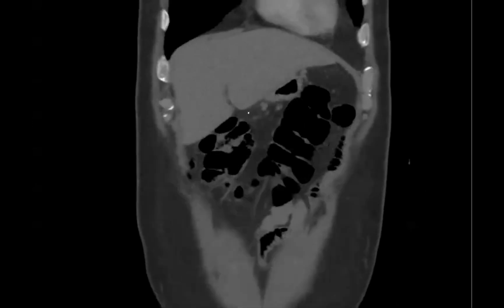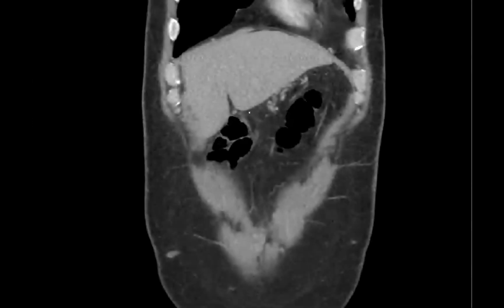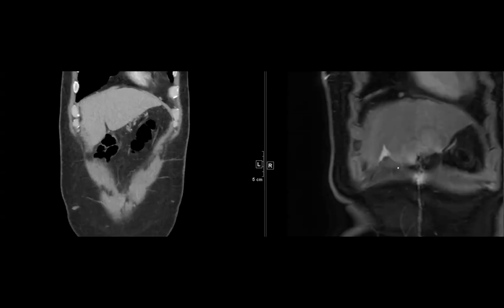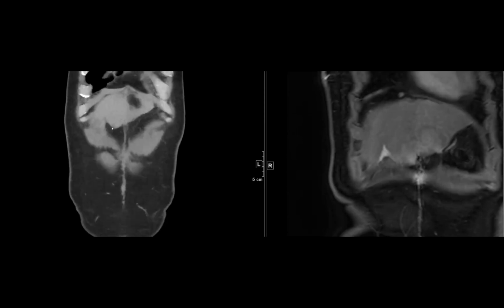Right, look, this was pretty clean looking, and I would expect that we would see something like here. Let me put it side by side. This kind of blunting, I would assume we would see if it was present, but it's not. It's pretty clean.